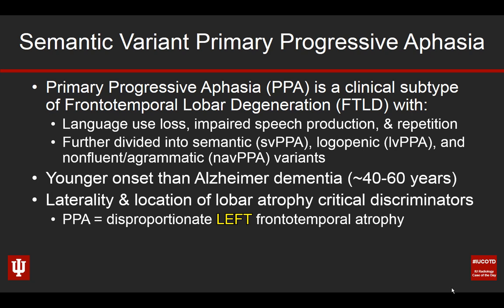If you have the behavioral variant of frontotemporal lobar degeneration, not always, but oftentimes they may have more volume loss on the right. That's not a perfect paradigm, of course. Patients with behavioral variants certainly can have disproportionate left-sided frontotemporal atrophy as well. But in general, most people are left-sided language predominant, so perhaps you can remember it that way. Maybe there's an association between those as well.